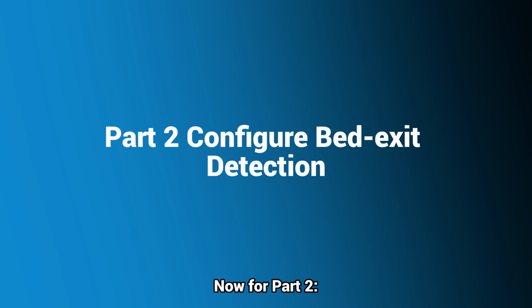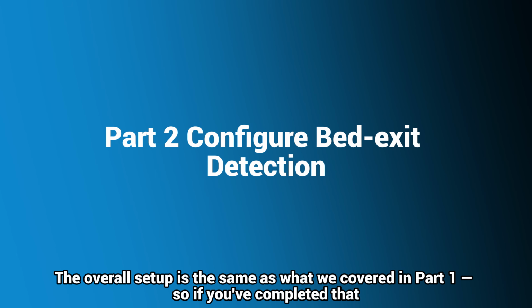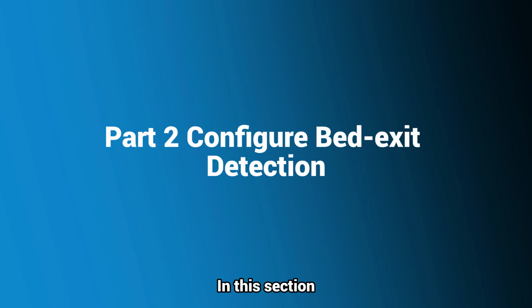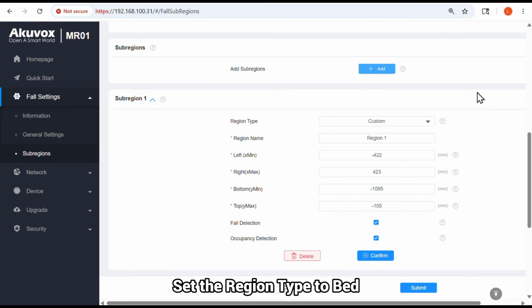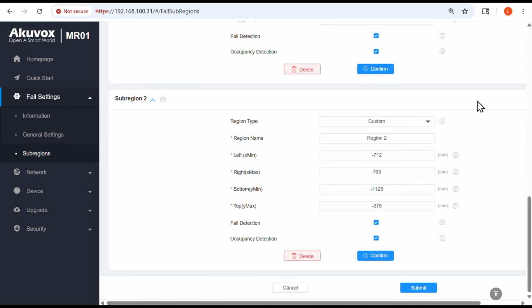Now for Part 2, Bed Exit Detection. The overall setup is the same as what we covered in Part 1, so if you've completed that, you're most of the way there. In this section, we'll focus on what's different, configuring a bed type subregion. Click Add to create a new subregion for the bed area. Set the region type to bed.